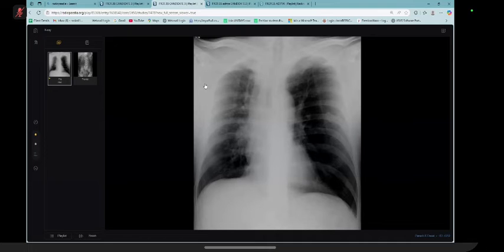So what will you do next in this kind of patient? Fibrotic. Sir, I would like to have a CT, and there are fibrotic strands extending out from the hilar towards the periphery. And also on the left upper side, there are areas of reticulonodular shadowing.